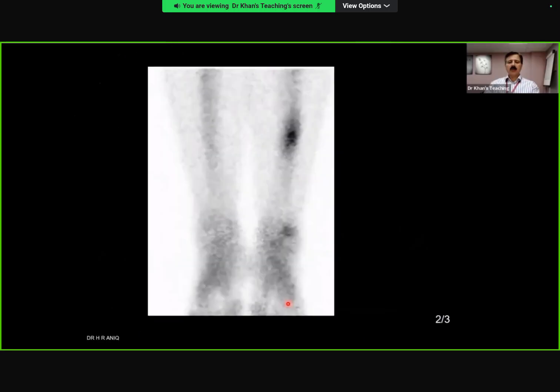Okay, very good. In this particular case, initially a nuclear scan was done, and the nuclear scan is not helpful. And this is a key exam point. Don't ask for a nuclear scan, because a nuclear scan is a sensitive tool but not a specific tool, and it shows uptake, and we are where we were.